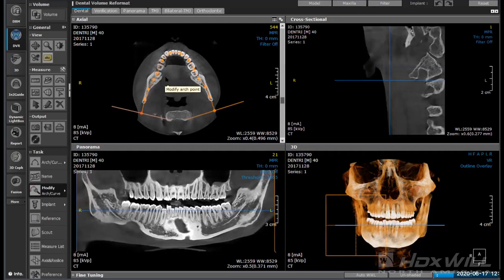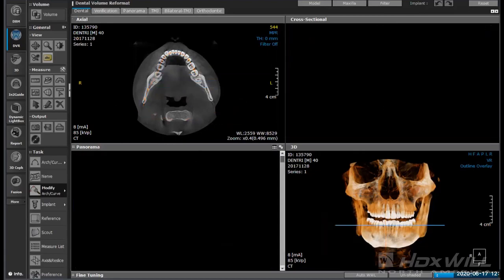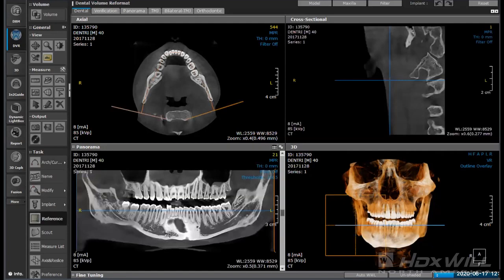And then of course, if I just don't like the way it was done or I want to do it over again, I can right click on one of those dots and delete this curve. So I'm going to go ahead and delete that curve. We're going to start over again. Same idea, going through, and we can go into auto arch, and it spreads it out very nicely for us.